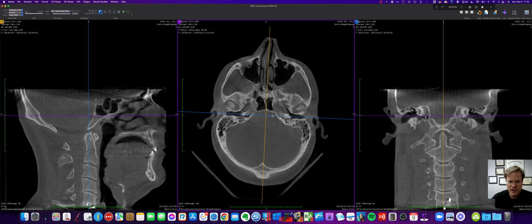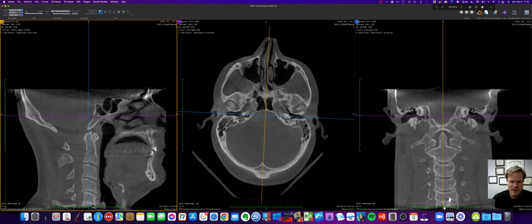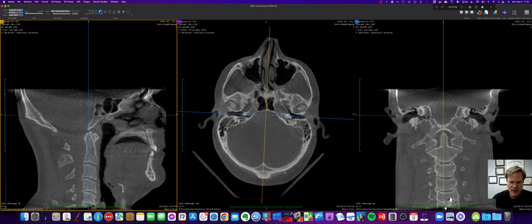I've just got it going straight down the center of each ear canal and kind of hitting the bottom of the skull on each side there. And then I'm going to make sure it's kind of in the center. I look at the internal occipital protuberance there, where the tissues are pulling that into a point, and kind of look here. I've noticed that the face often is not exactly square to the calvarium, and so I really want to look at the skull mostly.